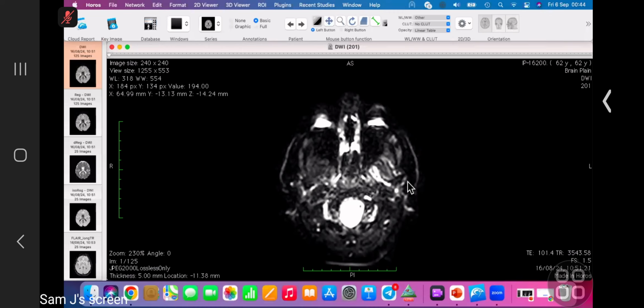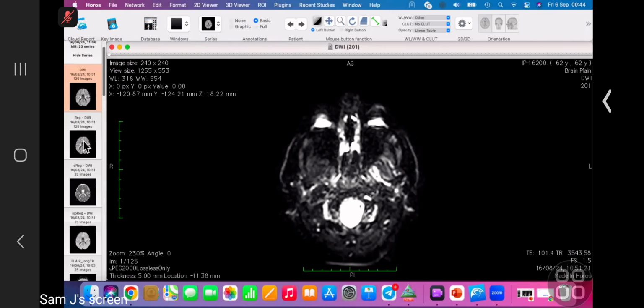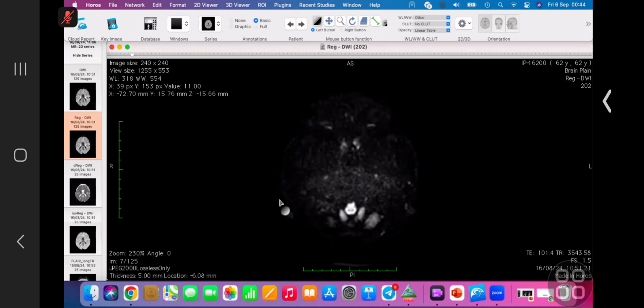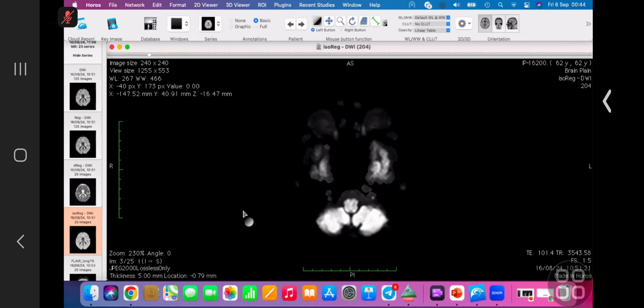Should I start? Yes, I'll first give you a DWI sequence. Just one second. This is the DWI.